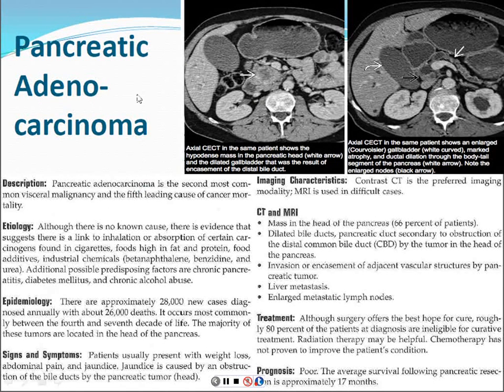These are some images of pancreatic adenocarcinoma. These are CT images. Typically, pancreatic adenocarcinoma is diagnosed and followed up by CT, just because this is a fairly visible lesion as far as they go. But sometimes the lesions can be quite small and quite subtle, and with the spatial resolution of MRI and a little bit of motion artifact that comes with MR imaging, it can sometimes be difficult to detect them. Now, I'm not saying you won't have studies to evaluate pancreatic masses. You certainly will, but it's just a little bit more common to go with CT.